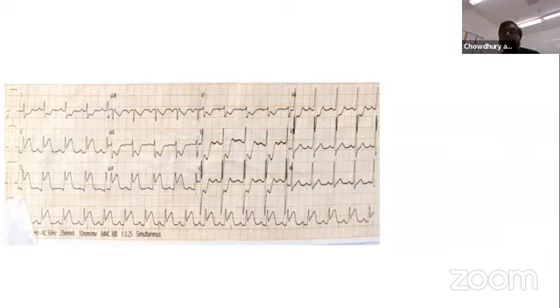So it is important that when you see this magnitude of ST elevation, you have the defibrillator available, because you may not have enough time. In that study from last year, there was almost a 15 to 16 times higher incidence of VF arrest if the ST elevation is more than 4 millimeters. So it is very important that the extent of ST elevation is recognized early.